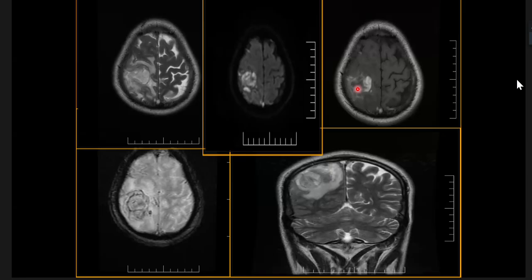What things in the scan help you point it out? Is it in any arterial territory? Is it in any venous territory, as in venous infarcts? Is it in a proper lesion-type territory, like the gray-white matter junction for metastasis, or is it a cortical lesion like an AVM? So what do you think? Cortical lesion, I feel. Very good. It is cortical, with some amount of subcortical extension, and surrounding vasogenic edema is there.